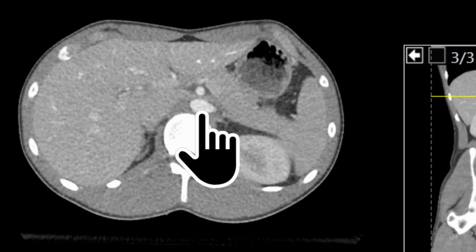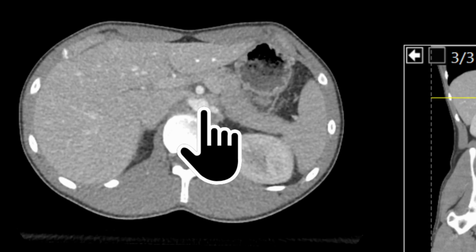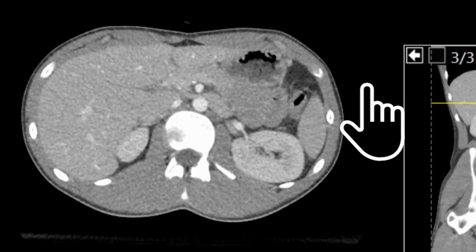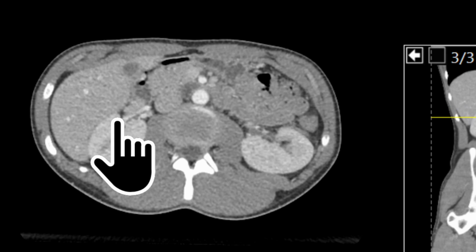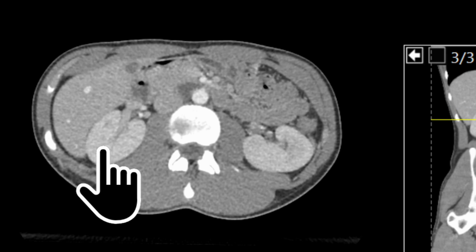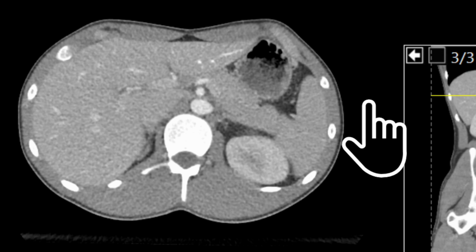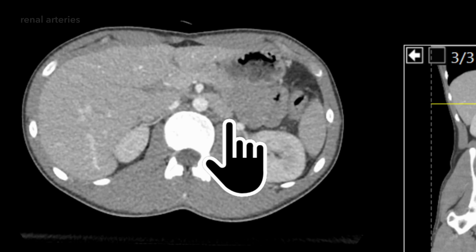And if we look at the aorta and scroll down a little way, we get a whoosh and a whoosh. We get two arteries branching off from the aorta. If we follow these, where do they go? Let's go in here and here. What is this and what is this? These are the kidneys. So if I scroll back up again, those branches coming from the aorta, they're lateral branches, big branches, which is why they're nice to identify. These are the renal arteries.